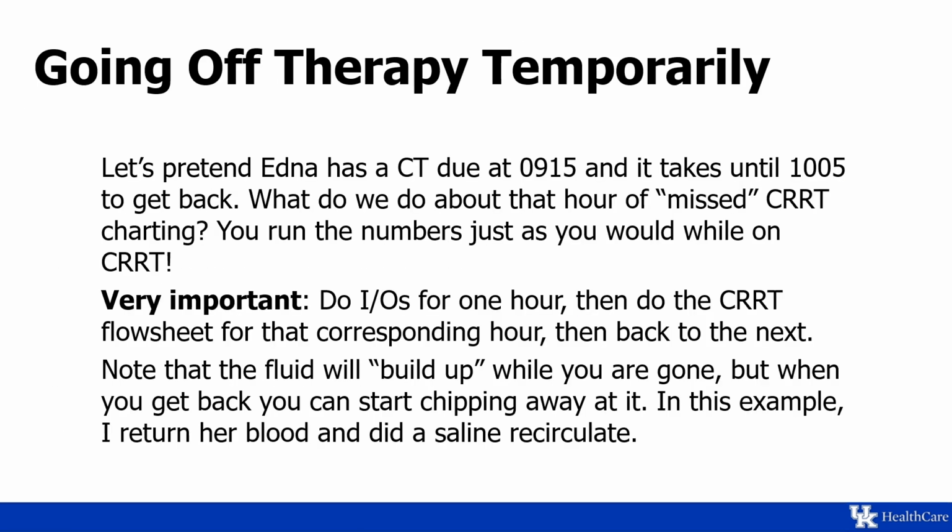Let's talk a little bit about going off therapy temporarily and how to keep our flow sheet working and also minimize the workload to ourselves. So let's say that Edna has a CT at 9:15 and it takes until 10:05 to get back. So we have an hour of quote-unquote missed charting at 10 o'clock. So what do we do? Just run the numbers like you would if you were still on CRRT.